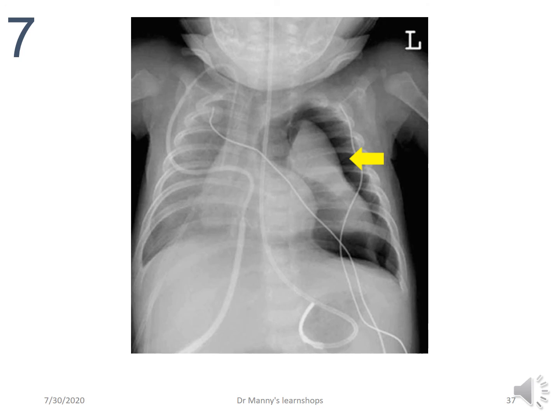Here's a paediatric patient. Look at symmetry of the lungs. Look at the trachea. Look at the mediastinum. Look at the left lung. Look at the right lung. This is an example of pneumothorax, probably a tension pneumothorax.